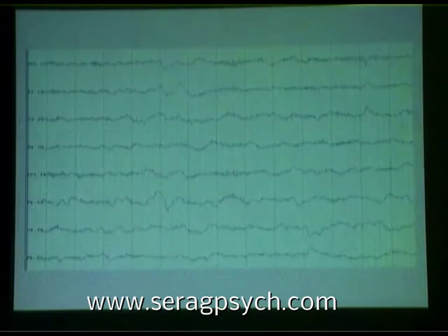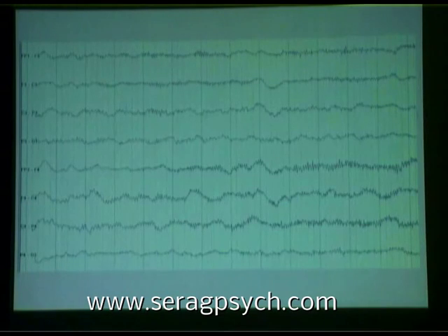Okay, next, please. And so then he very gradually starts having a seizure, and I'm not sure where that is. I think this is the beta activity of the interictal, but you can see that he's getting kind of drowsy here and is getting more delta, and I'm only showing the top half of the recording now. Okay, next, please. And now you can see that yes, he had beta activity here, and yes, he had beta activity on the right side. So more on the left than on the right. But notice this is a seizure, okay?